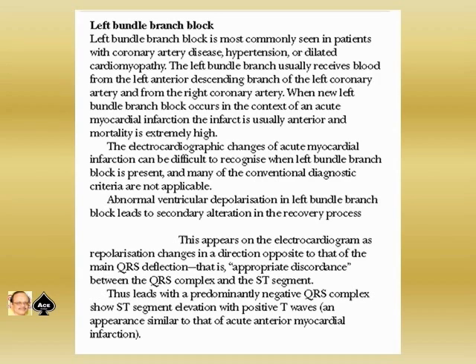This appears on the electrocardiogram as repolarization changes in a direction opposite to that of the main QRS deflection, that is appropriate discordance between the QRS complex and the ST segment. Regarding this appropriate discordance, I will deal with it in another video session. Thus, leads with predominantly negative QRS complex show ST segment elevation with a positive T wave. That's an appearance similar to that of acute anterior myocardial infarction.